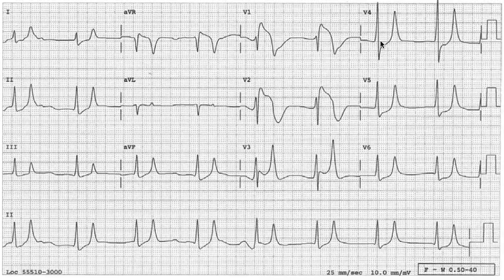is typical for hyperkalemia. So if this pattern is hyperkalemia, why are we having ST segment elevation here in V1, V2, and also V3? If you look closely, you can appreciate there's an R wave, first R wave, then S wave, then second R wave. So coming from the second R wave, the ST segment is downsloping and ending into an inverted T wave. The same thing is happening in V2. This pattern is called Brugada pattern, which is an acquired Brugada pattern because of hyperkalemia.